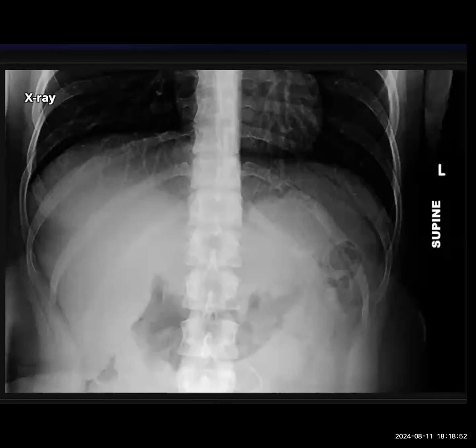If I tell you that the patient had a recent procedure, what would you be looking for in the radiograph? Any abnormal air within the visualized sections, or any stent which is probably misplaced. Exactly. Now, can you pick up anything abnormal in this radiograph? I can see a linear radiopacity at the lower edge of the film, just in the paravertebral region.